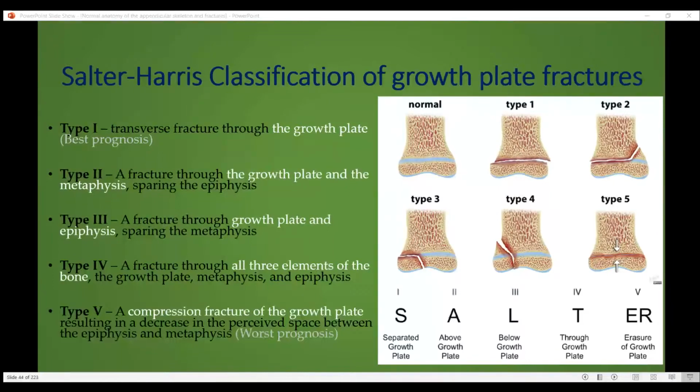You cannot take the dwarf as particularly child X-rays. They do not have the properties of child X-rays. Yes, some zones of ossification will be lost in dwarf people, but the bones will be showing the buildup of an adult person itself.